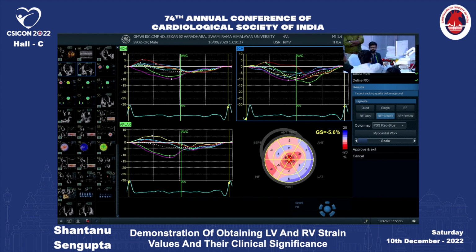That means he wants to insist that uniformity of synchronous contraction is not there in this patient. Dyssynchronous contraction is there in this patient. What does it indirectly imply? This dyssynchrony will lead subsequently to arrhythmia and sudden cardiac death. This dyssynchrony should not be there.